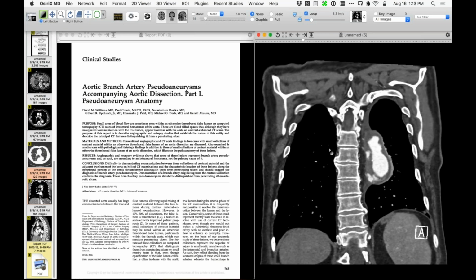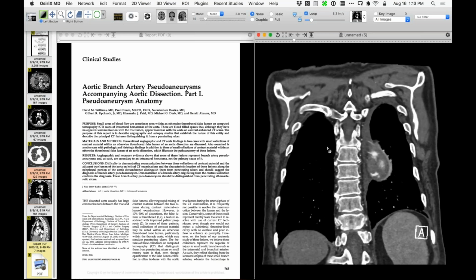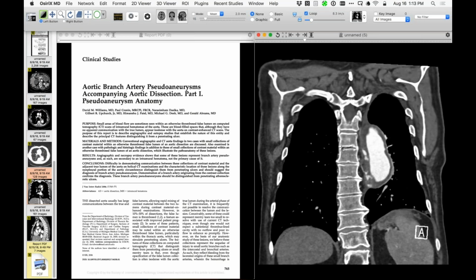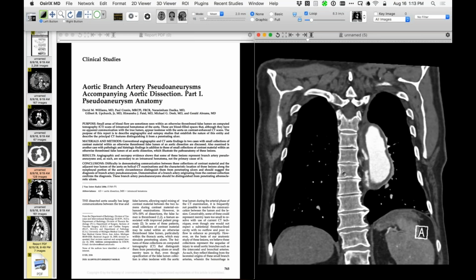And the amount of blood in the wall of the aorta is a little bit increased from the scan a few days earlier. But yeah, they managed them conservatively, even with a fairly dramatic finding here. Well, it's kind of dramatic on the CT in a way.